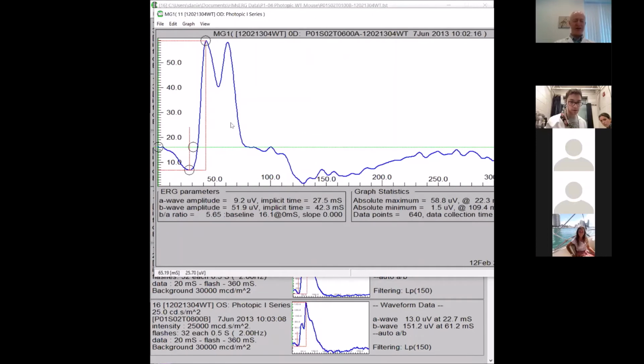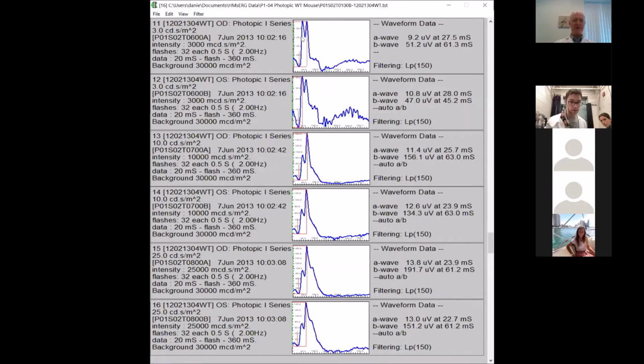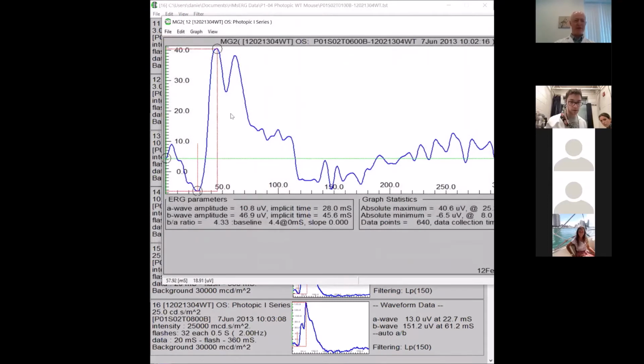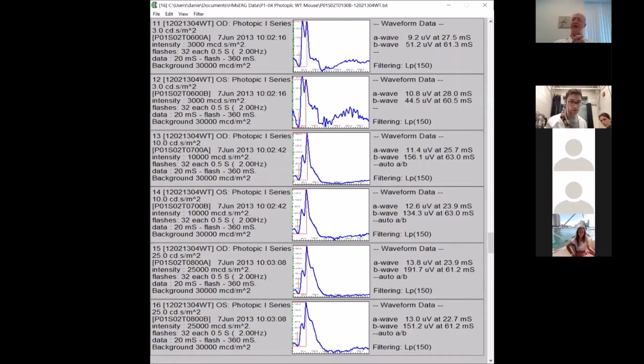In here, you can actually change the position of the peak and the minimum of the waveform. So this is something that is adjustable and can then be saved. And you can see the update is then captured in our software. I'll do the same thing for this same waveform for the B channel. I'll just scroll that over and put this on the second peak over here, just as an example. Okay, so now we are able to adjust. That's a very important thing: review your data, make sure that your measurement positions are correct, and then save that data before you conduct any more analysis.